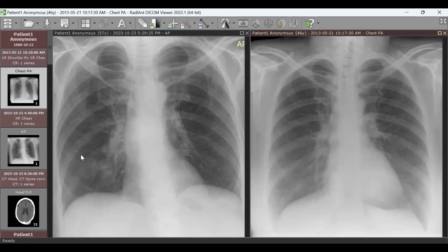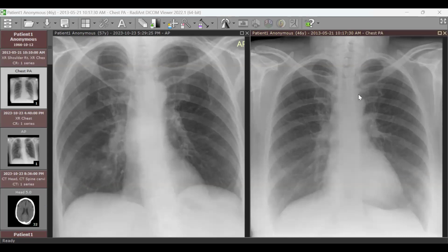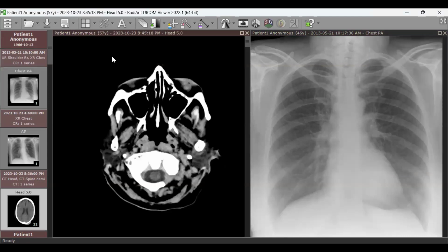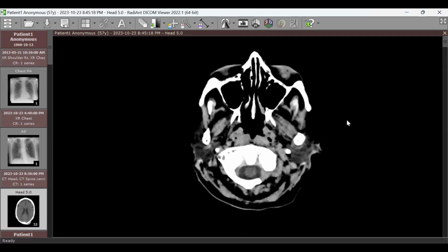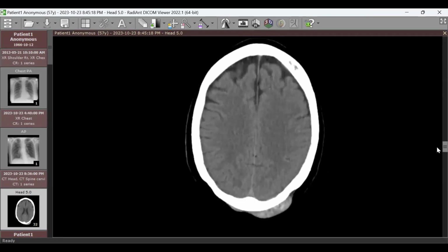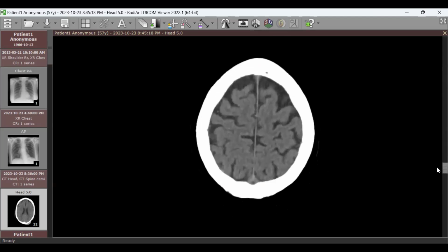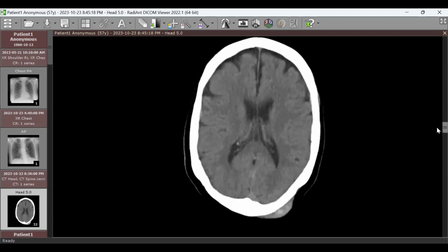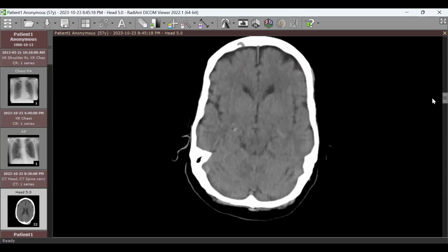And since the patient had a head injury, of course, the patient had a brain CT. I'm going to show it to you now. Start describing the brain. Can I see the bone window? Okay, that's great.